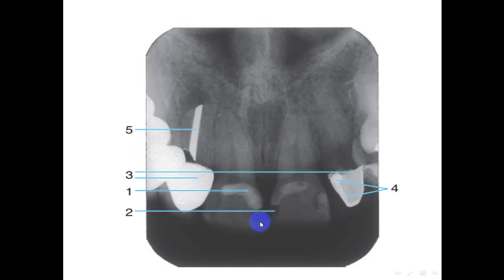This is a very old material used for anterior restoration, which is the semi-radio-opaque composite and radiolucent composite. Nowadays, it is all replaced with a radio-opaque composite. 3 is the porcelain fused to metal crown.